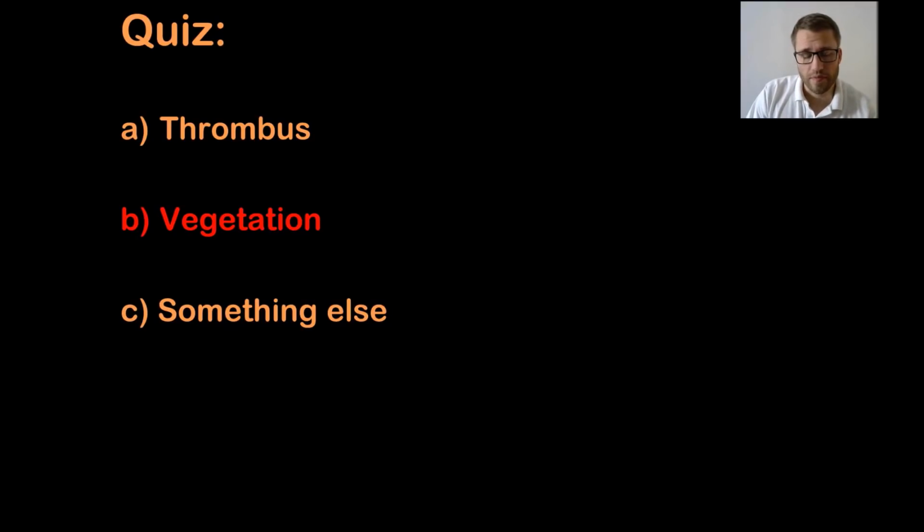And the pulmonary embolism is very conclusive with this diagnosis, because you saw how much movement this vegetation had and how loosened it was, with only a little attachment there on the lead.